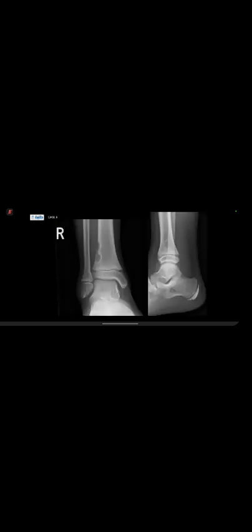Candidate 2. Yeah. So I'm given the frontal and lateral radiograph of the right ankle joint of a skeletally immature patient. I can see a well-defined eccentric cortical-based lytic lesion in the lateral distal cortex of the tibia, with well-defined sclerotic medial margins, narrow zone of transition, no periosteal reaction, and some deficient cortex on the superior part.